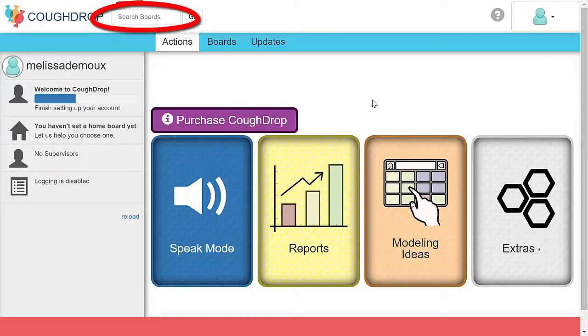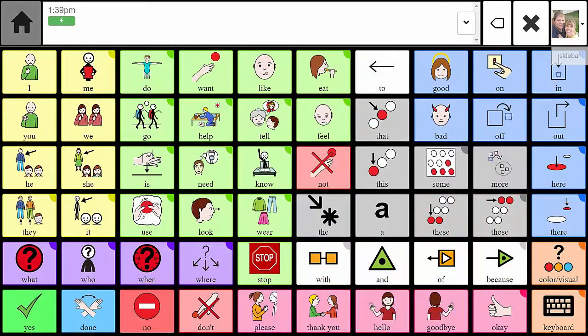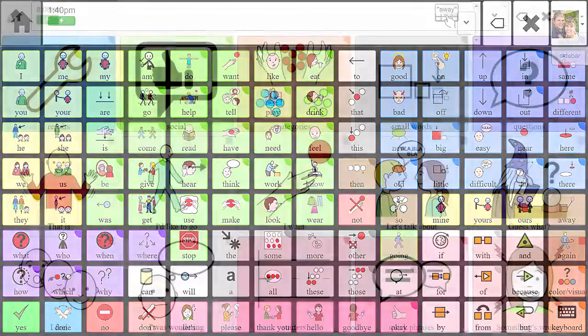of most CoughDrop screens. CoughDrop has many boards created to fit specific needs, but also allows AAC users and supporters to share boards they have created publicly so they can be accessed by other CoughDrop users. Many AAC professionals understand the importance of core vocabulary when it comes to communication. CoughDrop offers 3 quick core vocabulary board sets in varying sizes to fit the needs of communicators. These boards display between 24 and 112 speech buttons per board and allow reach of hundreds or thousands of words within 1 or 2 button presses.